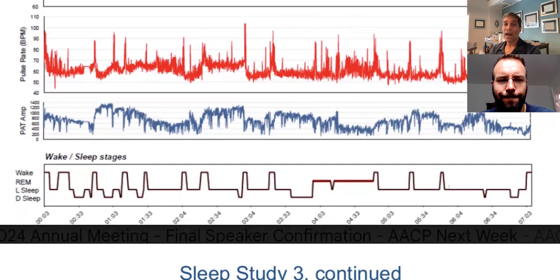And once again, wow, light sleep, deep sleep, REM, one cycle. And then not even a cycle of one, not even 4 to 6 cycles. And how many awakenings? 1, 2, 3, 4, 5, 6, 7, 8, 9, 10, 11 awakenings, more than the last person. And how many had a deep sleep? That person had three. 1, 2, 3, 4, 5. So 5 of the 11 woke them up out of either slow wave or REM sleep, which is substantial.